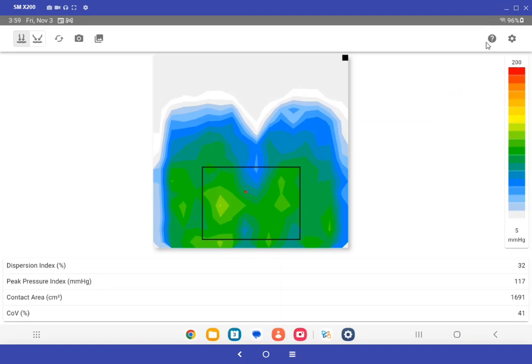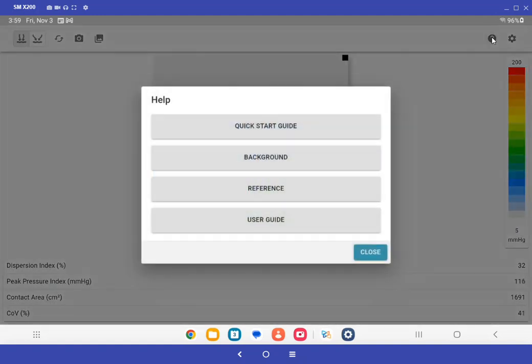If you click on the information icon here, you'll get a table like this, and these are some helpful tools for you. Again, quick start guide, just a helpful reminder how to connect to the system. Again, battery to the sensor before you try anything, so that you've got a valid Wi-Fi signal, and then you connect with a tablet to it, and off you go with the software.